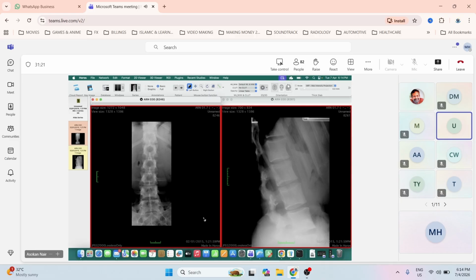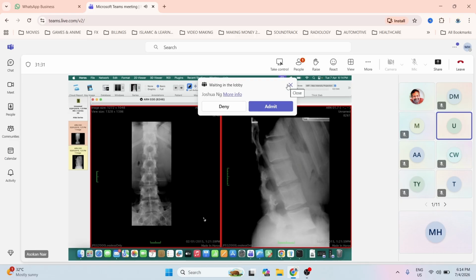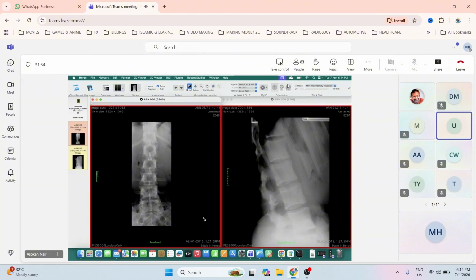Good evening, Izudin from IIUM. So this is the lumbosacral radiograph in AP and lateral projection. In the AP view, I can see there is abnormal widening, an increase in the interpedicular distance with narrowing of the pedicles. We cannot appreciate any focal lytic or sclerotic bone lesion.